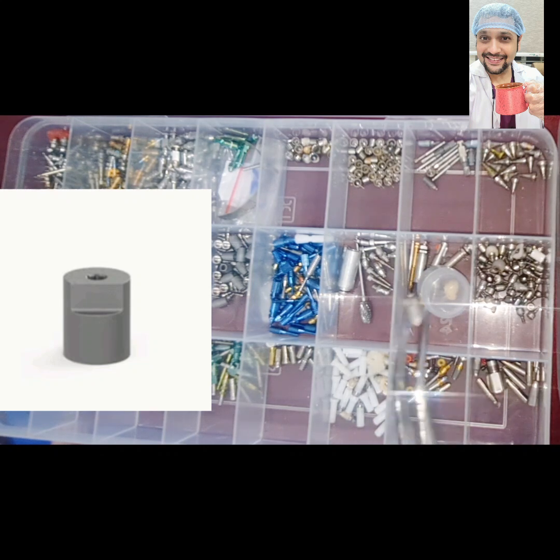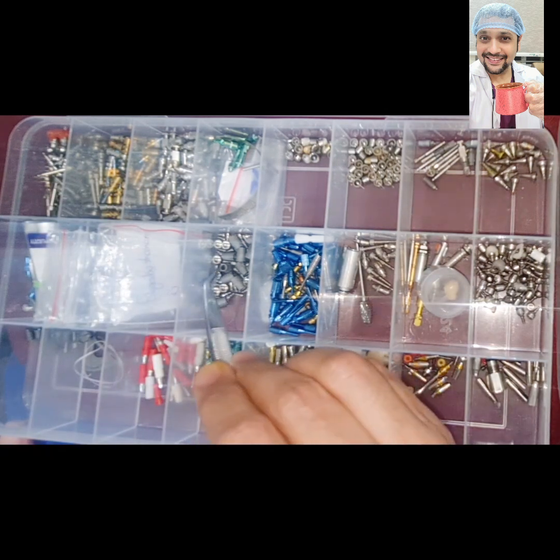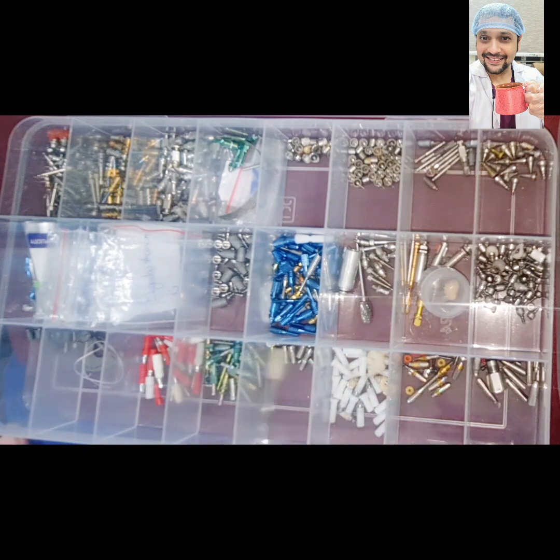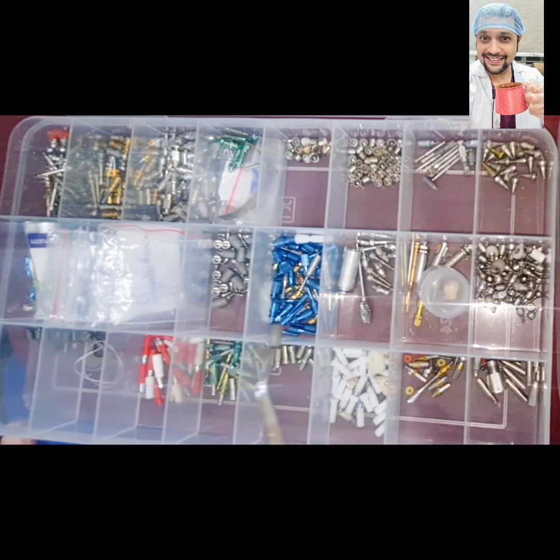So you don't have a hex here. You have a flat surface which goes and sits on the platform of the MUA. So either the coping or the scan body. And these are known as universal scan bodies, which are used for many cases. These universal scan bodies can be utilized on any system with the prosthetic screw of that particular system, and you can scan it up. And this is only for MUA level.